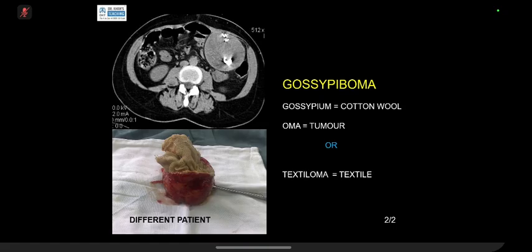And sometimes the key point is that you go back to the concepts. The swabs which are used in surgery have got a thread of barium. We call it barium impregnated thread. That is why if you X-ray them, you can see them. That is the concept, because they have got their own protocol. It's a never event in UK. I have not seen any UK patient in my practice here in 20 years. I've seen 4 or 5 overseas ones. The key one was the artery forceps, left hand side. Can you imagine the patient passing through the security every day?